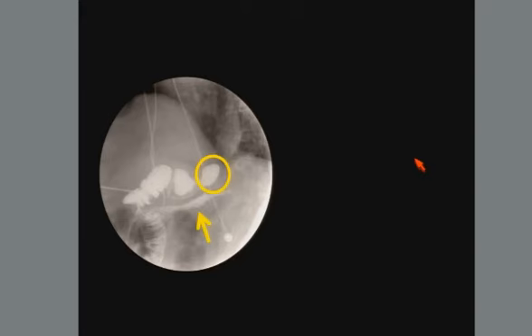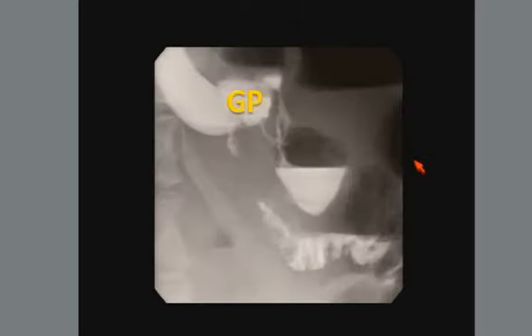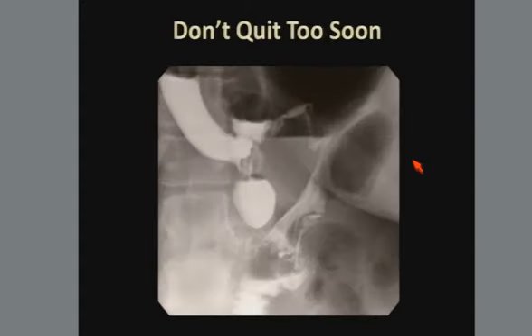You can see the pouch here, but you also see contrast filling another structure with gastric folds, and this is confirmed with emptying into the duodenum. So this is a gastrogastric fistula. And this is another patient, gastric pouch here. Here's the roux limb. Here's the blind roux limb. Extraluminal contrast was thought to be communicating into the gastric body, again a gastrogastric fistula. However, with repositioning and specifically placing the patient into an LPO position, you can see it freely spilling into the peritoneal cavity. So that's an important differentiator for us to make, and it's really not one that we can hedge on.